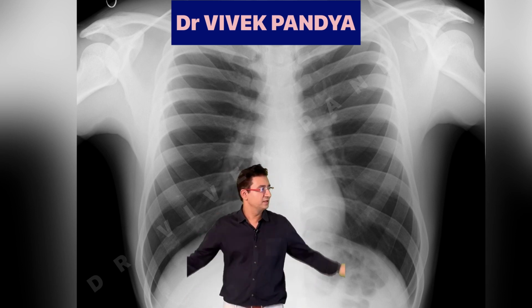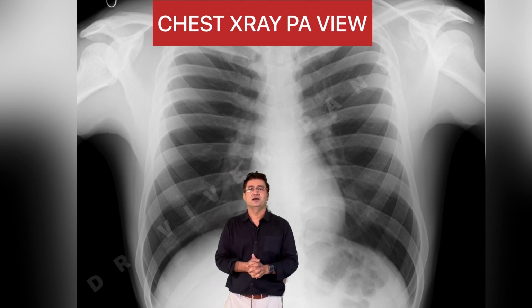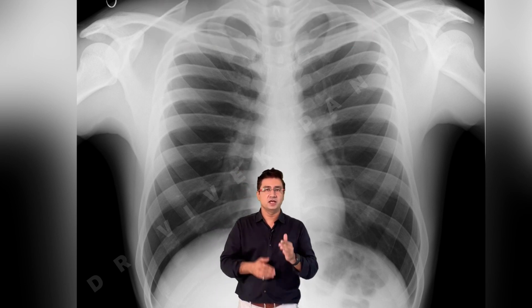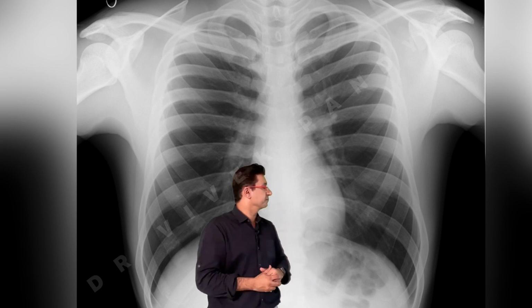So here is the chest X-ray, as you can see behind me, a posterior anterior view. The structures which you can see in the chest X-ray are depicted here. So let's start very fast, in brief.